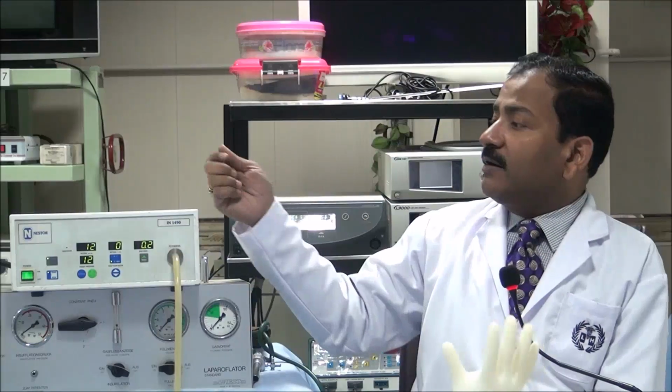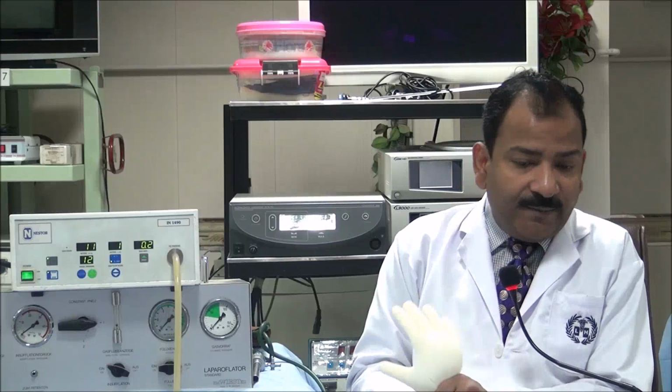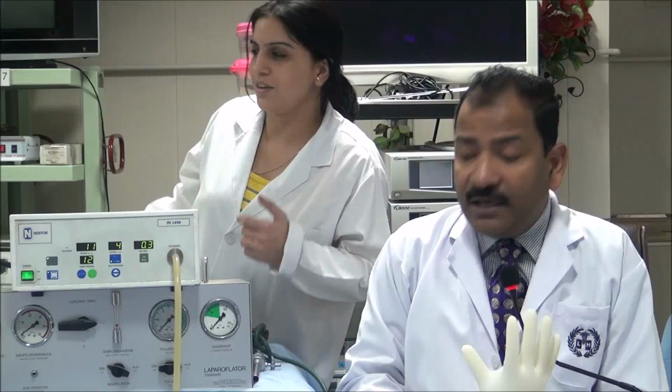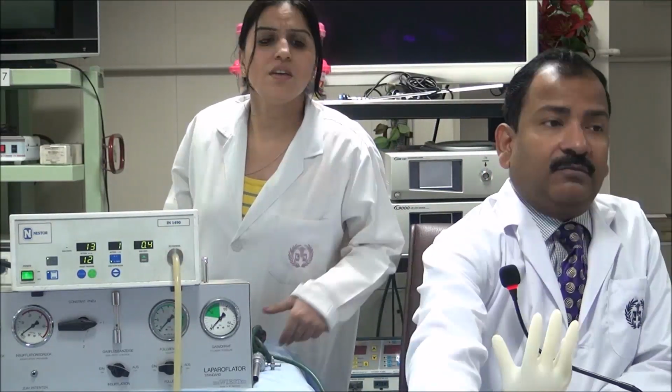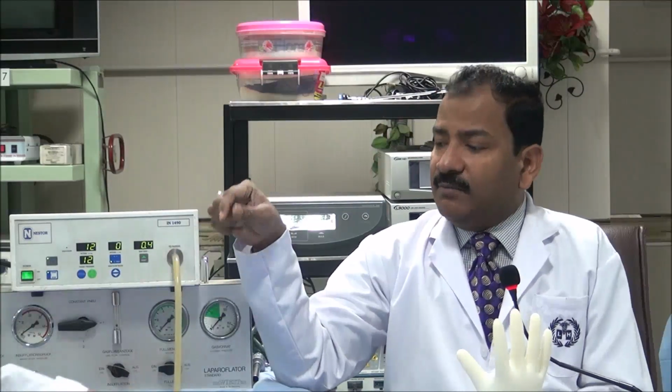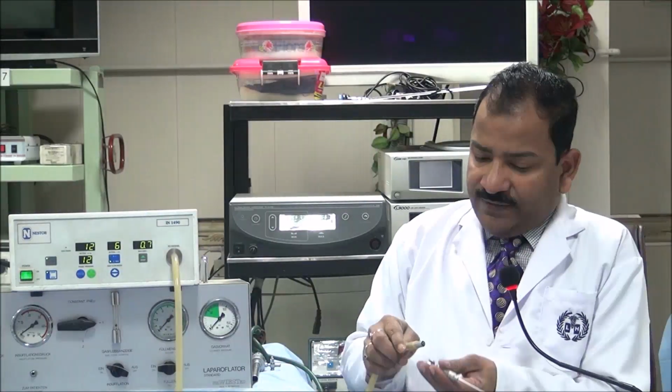So where can we block? Veress needle block. Sometimes there may be a block in the Veress needle. The Veress needle was not cleaned properly. Or suppose the valve of the Veress needle was blocked. Or suppose the tip of the Veress needle is touching some bowel or omentum. Like suppose this is the Veress needle and it was attached, and now accidentally you have closed it here. Now it will give alarm.